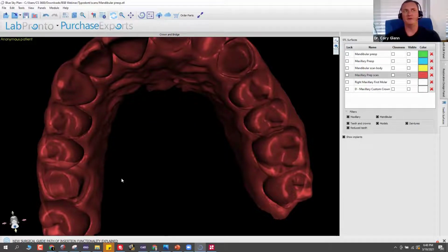Now, if you do that, you've obviously got to be aware of the opposing tooth. And so, later in the design phase, there's actually a color intensity map. You didn't see it on that one just because it didn't have an opposing tooth, but you would see that color intensity and you could know if it's high or when it's just right, and you could adjust accordingly. If you still don't have adequate thickness after doing that, well, that's a prep problem, right? You just didn't reduce the tooth enough. So that's kind of out of the software's control at that point.